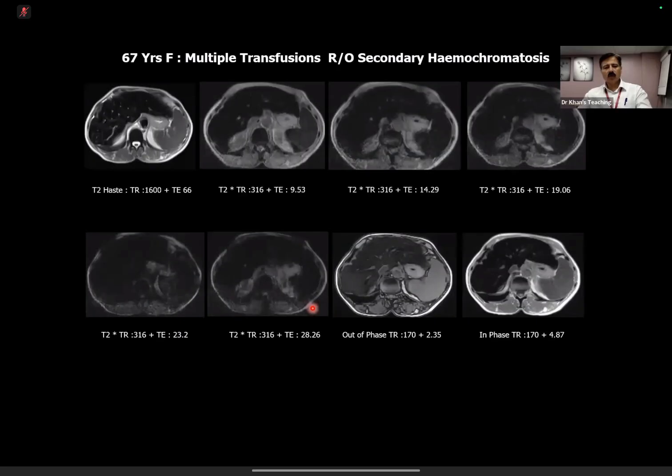Excellent. Okay, so I take over now. Basically, hemochromatosis is an exam case. It has come in the exam. They can show you hemochromatosis with cirrhosis, with HCCs, with pancreas involvement, which was a good pertinent point pointed out by candidate 5. You have to see if the pancreas is involved. If the heart is visible, you have to see if there is something going on there also.